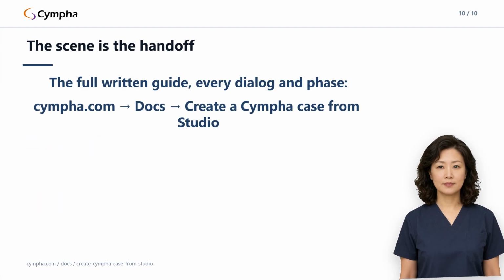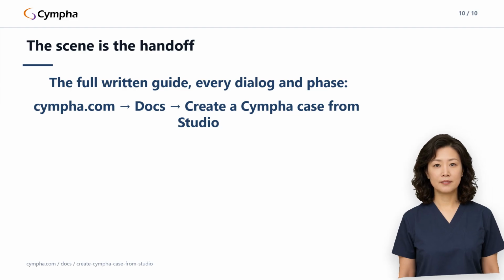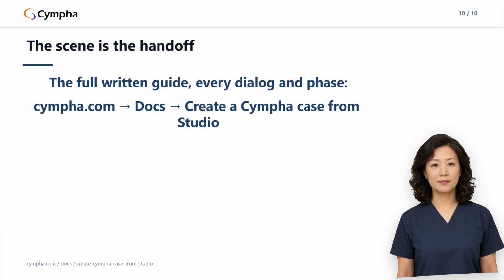That's the flow. Assemble the virtual patient, 1 menu action, a folder name, and the form's 3 decisions, and the lab inherits your scene, not a pile of files. Once you've submitted this way a single time, the download and re-upload routine starts to feel like what it is, a lossy workaround. The companion lectures, Studio Essentials before this, and Approve or Reject a design after it, bracket this one on either side of the case's journey, so the whole path from first scan to approved design is covered.